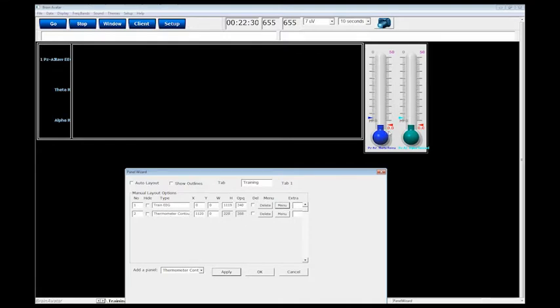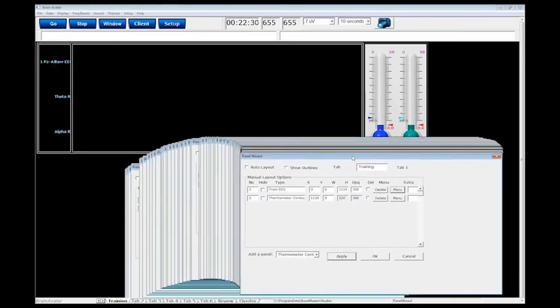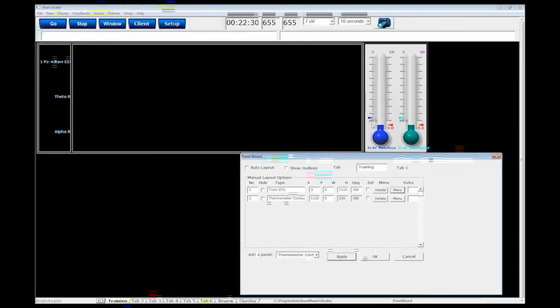If you change the size of it, you're not going to actually change the physical shape of it. So for something like this, what I would probably do is change the height of my train EEG window so that it lines up with the bottom of it. I am going to do that by typing in this size so that it matches this size. Then I will hit apply, and it will go right to the end of it. So now this has your basic information on it.